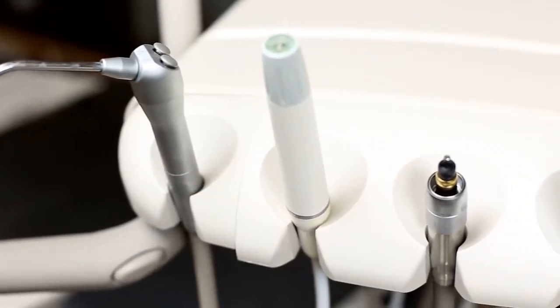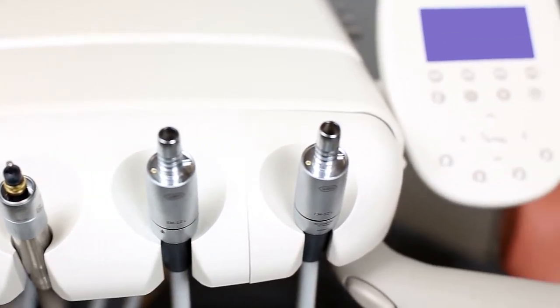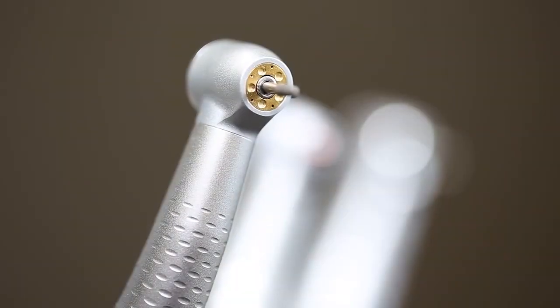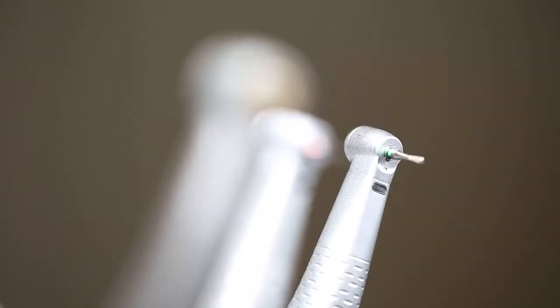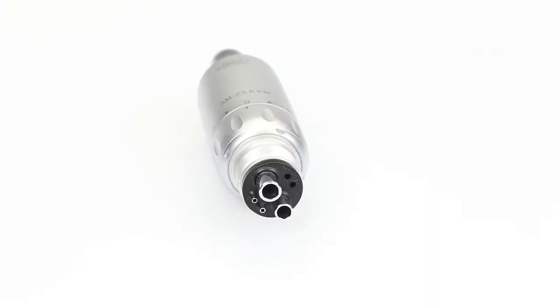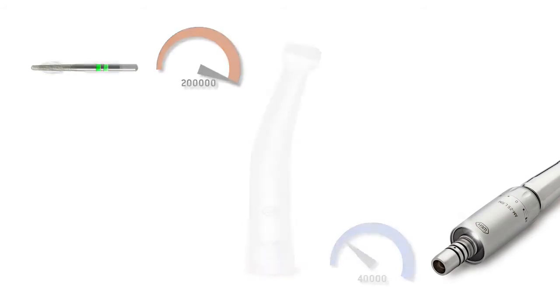Depending on which drive possibilities are available to a dental unit, different possibilities are available to the user for achieving these speeds. At a basic level, we can differentiate between air-driven and electric-driven transmission instruments. Compressed air is used to drive dental turbine handpieces and air motors, which can then power green and blue straight and contra-angle handpieces. Red contra-angle handpieces operate faster than the drive speed. This means that the operating speed of the rotary instrument is higher than the motor speed.